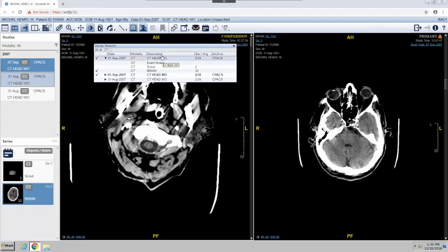You can use the modality filtering controls at the top of the series selector to minimize or maximize the list. Filter selections are retained for the remainder of the logged in session or until a new study is launched from the work list. In the series selector, the primary study displays in bold. A series currently displayed in the viewport has a check mark next to the series selector.